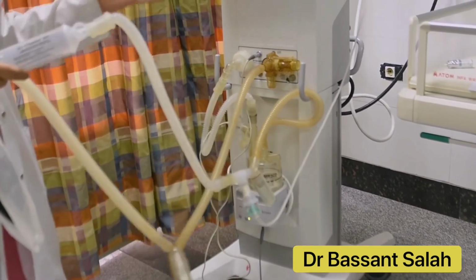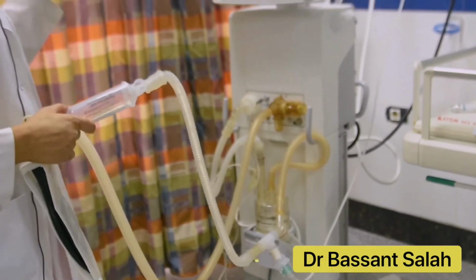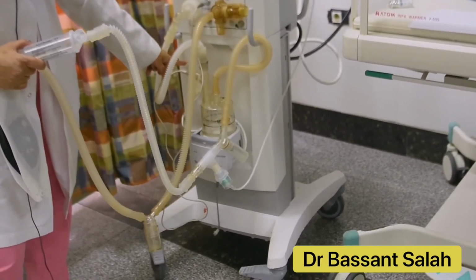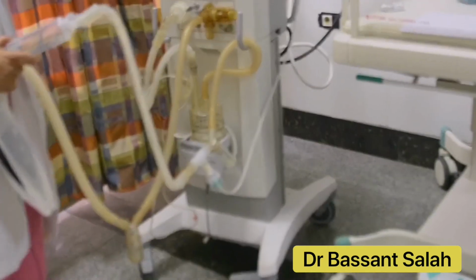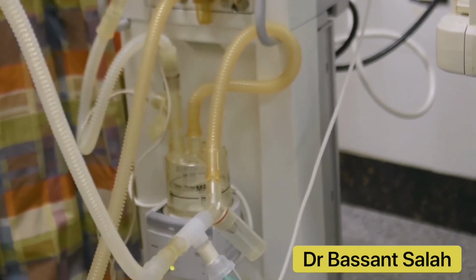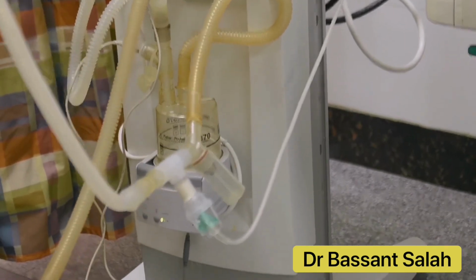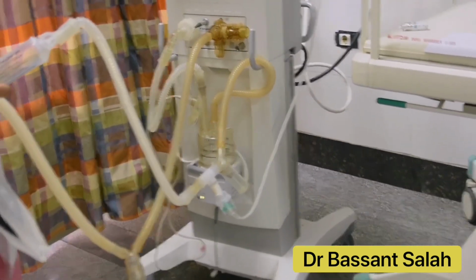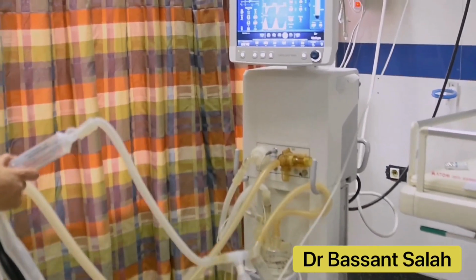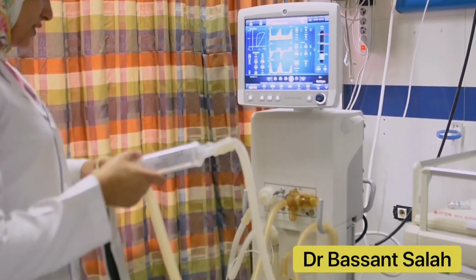And which one of those 3 types is more effective in delivering the medication? First and number 1 all over the world is the vibrating mesh nebulizer, because of safe delivery of medication, it is above the patient circuit and not below the patient circuit, so less contamination. Number 2, lower MMAD for the medication. Number 3, it can be filled with a small volume of medication with lower residual volume to ensure adequate delivery of the medication to the patient.